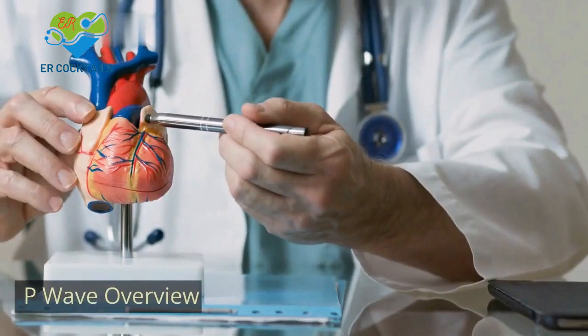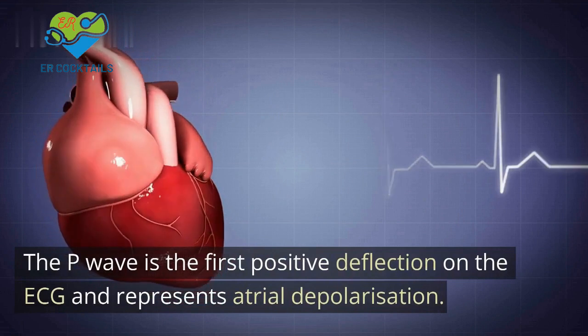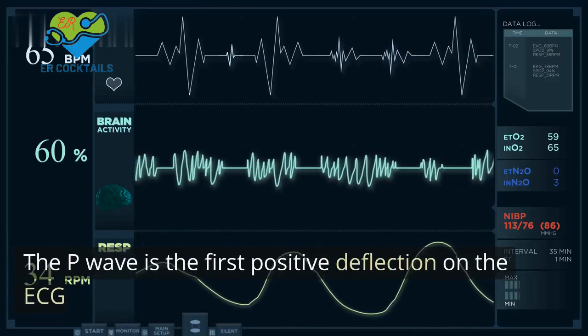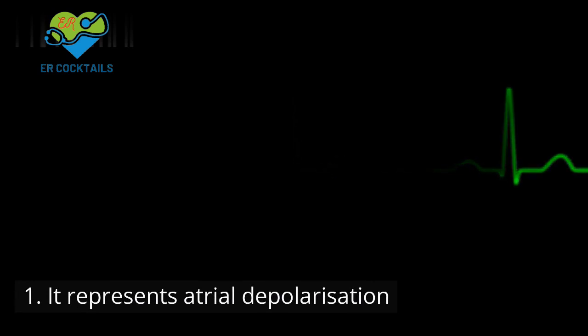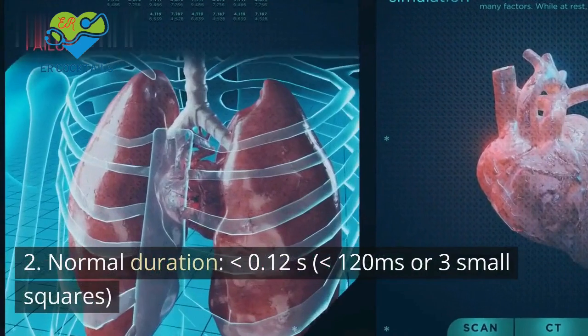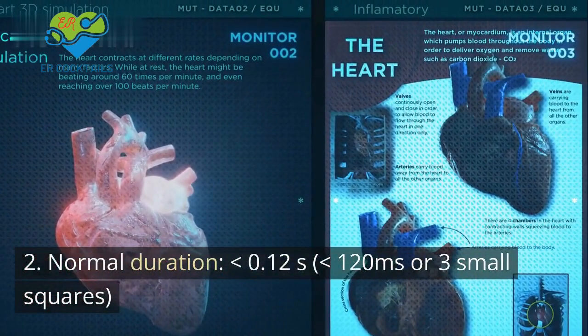P wave overview. The P wave is the first positive deflection on the ECG and represents atrial depolarization. The P wave is the first positive deflection on the ECG. 1. It represents atrial depolarization. 2. Normal duration, less than 0.12 s, less than 120 milliseconds or 3 small squares.